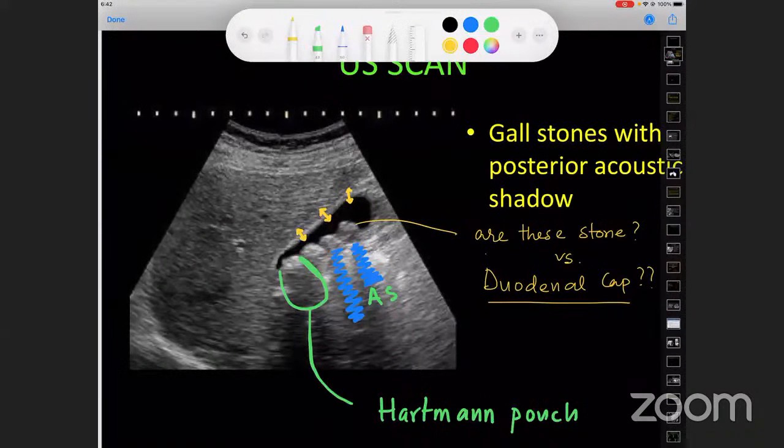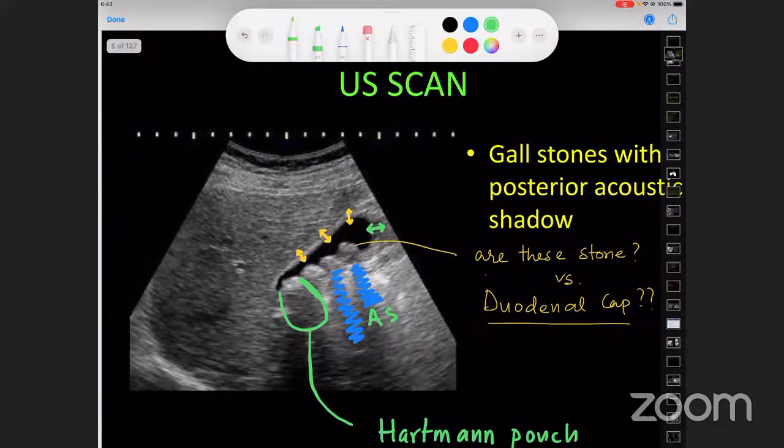Now, if that gallbladder has acute inflammation, you have a thin rim of fluid, which is lighter in color, around not just the serosal aspect but also the hepatic aspect of the gallbladder, which means there's an echo-lucent area on top and below. Also, I need to know from my radiologist whether the thickening is symmetric or asymmetric. The moment you have an asymmetric thickening, you start getting worried. Are we treating something which is not only an acute inflammation?